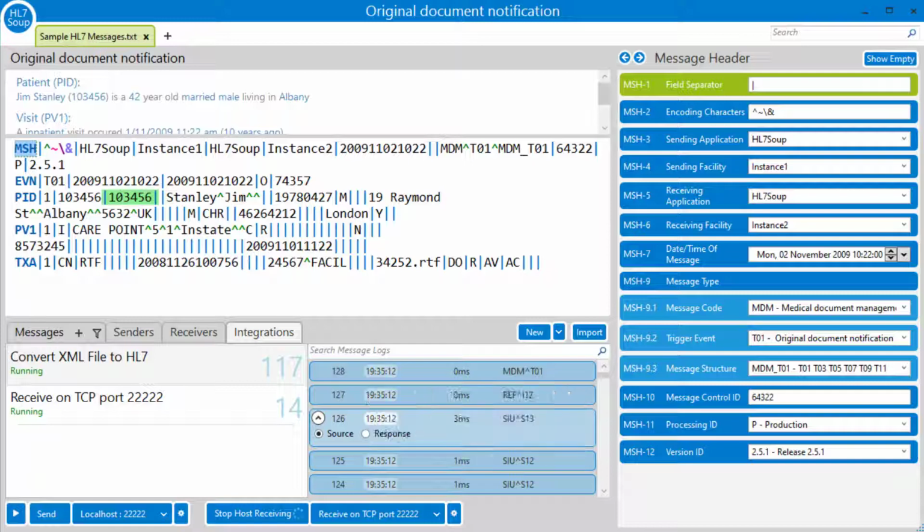I can now use the logs to review my messages, or even load all the logs back into the editor's message list. As promised, here's the link to the highlighting and validation tutorial and the Getting Started tutorial for Integration Host.